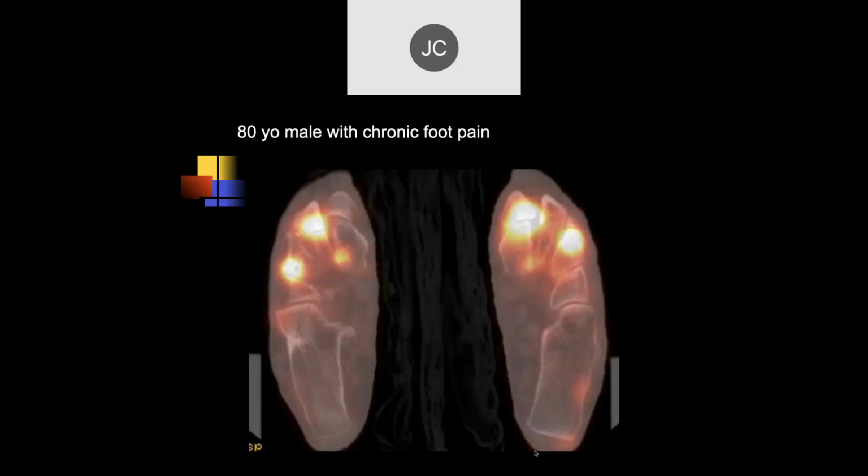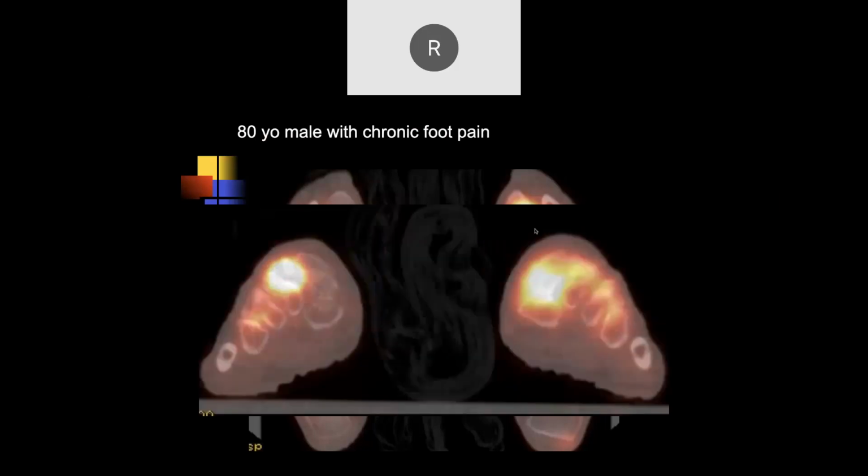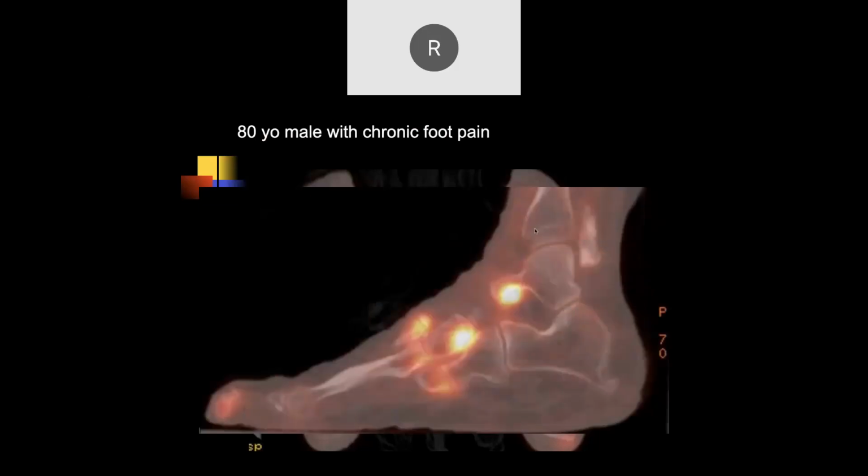All right, so we have an 80-year-old with chronic foot pain. This looks like a PET scan. There's a lot of increased tracer at the TMT joints. I would suspect degenerative disease. This was a patient who had Charcot disease, and that's just what a PET scan looks like in someone with Charcot disease, not that you would use a PET scan for the diagnosis.